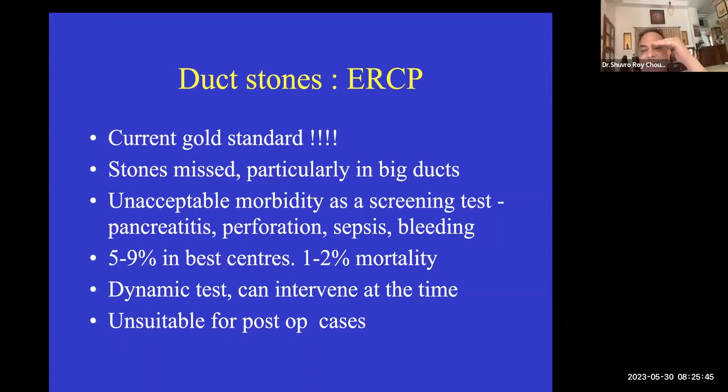When you're doing a CT or MR, remember, you are cross-sectioning, slicing that artery, that bile duct, that colon. So you can see the lumen, but you can also see the wall, and you can also see what is outside the wall. So this is a basic principle of radiology: cross-sectionography is superior to luminography, because not only can you see the inside, but you can also see the wall and the outside.